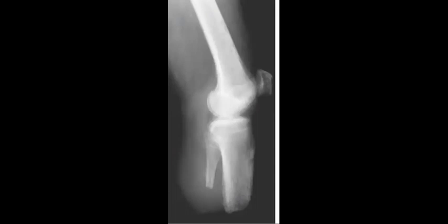The remnants of tibia. Okay, perfect. And also the fibula. So you see that the density here of the bone is not well. So, permeative lesion, and you will mention that wide zone of transition or narrow zone of transition.